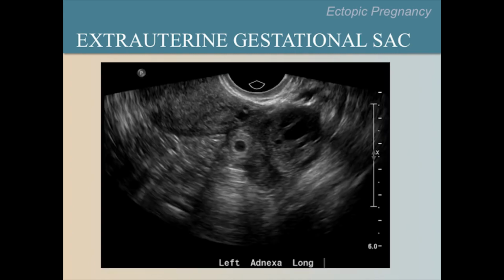Here is another example. Can you see the gestational sac and the ovary in these images? Please ask a volunteer to point out these structures and pause the video. Here we have outlined the ectopic pregnancy, ovary, and echogenic fluid around the ectopic and ovary, noted with crosses.